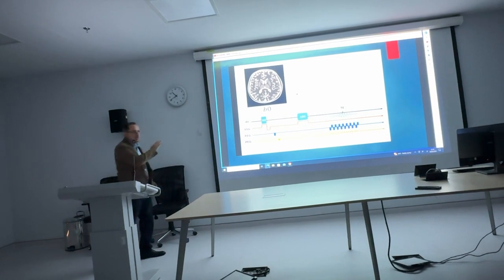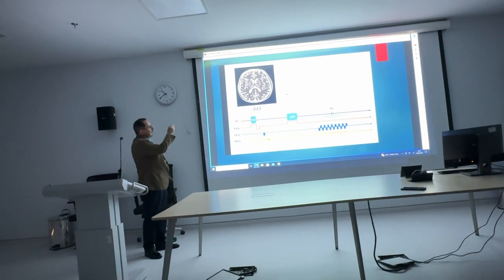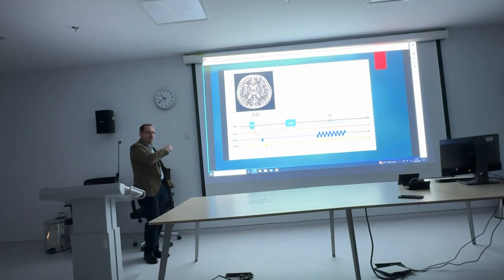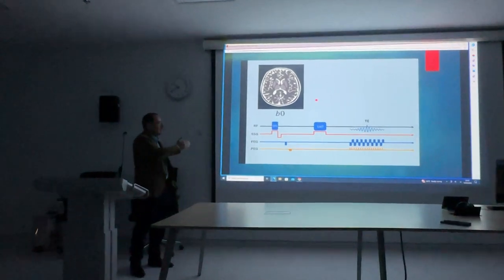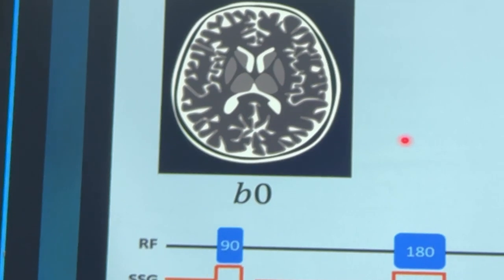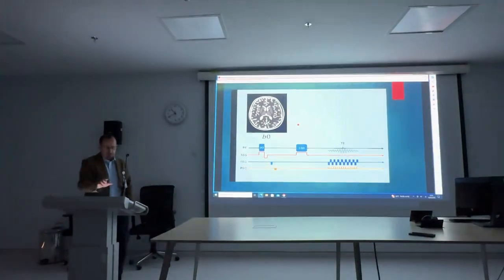So we got this image. Criteria of T2 are present in this image. Fluid is high signal, with less gray signals, and we can summarize the point: long decay gives us the bright signal, and early or short decay gives us the dark signal. Okay? This is the basic study, we call it the B0.